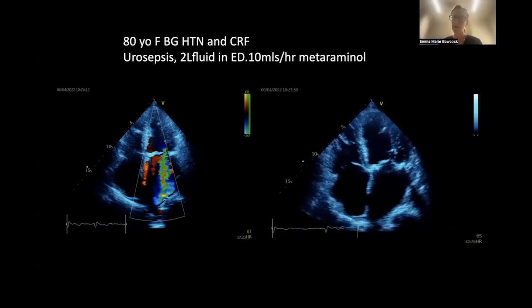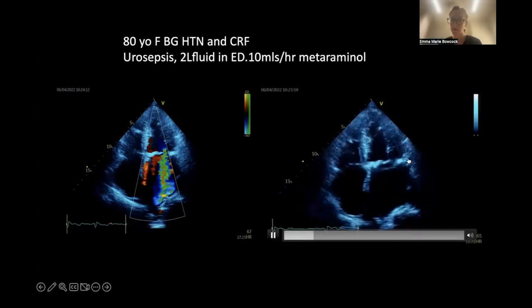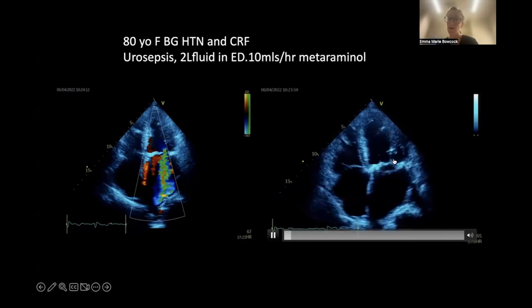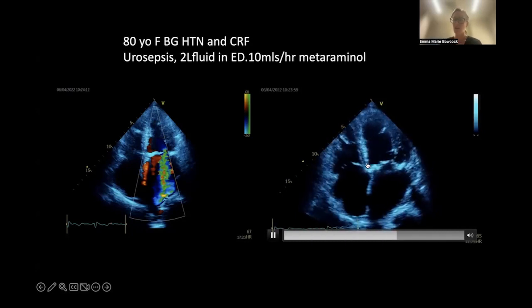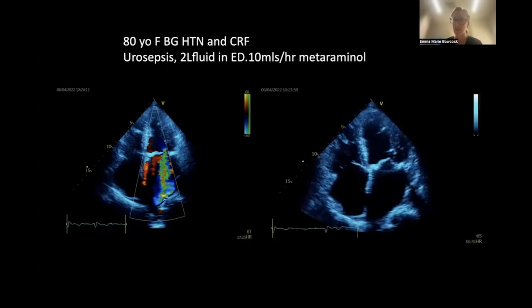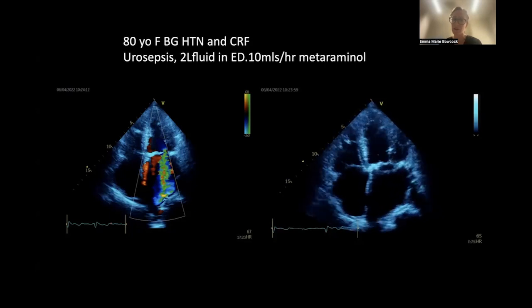Yeah, that's nice, Ben. I agree. You need to put everything together, but it seems like it's probably going to be a combination of atrial functional MR, because the atria is the size of a house, but also there is a little bit of tethering, and significant calcification, not uncommon in chronic renal failure and hypertension. So there's probably going to be a bit of degenerative or calcific mitral valve disease as well, combined with annular dilatation.